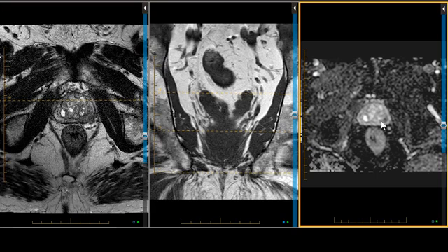So, 3 Tesla study, posterolateral tumor. This would be a PI-RADS 4/5, depending upon whether we measure it at less than 1.5 or greater than 1.5. The reader said slightly greater than 1.5. I measured it, I got slightly less than 1.5. So I'd be reading it as a PI-RADS 4. The reader read it as a PI-RADS 5. This looks like a moderately aggressive lesion. Diffusion image, not that bright. ADC map, not that dark. Hypervascularity, some, in fact, moderate. Compare this to our 1.5 comp vignette. That concludes this one.